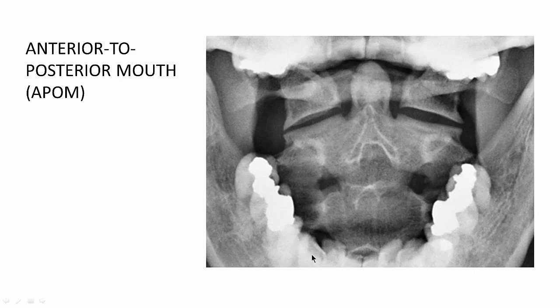Obviously these are the teeth, right? He's had some fillings back here, the back molars. So the obvious one is the dens. So we can see the dens right here. So here's the body. Now steamrollered. So here's the spinous process smashed on the body. The body's also underneath here as well.